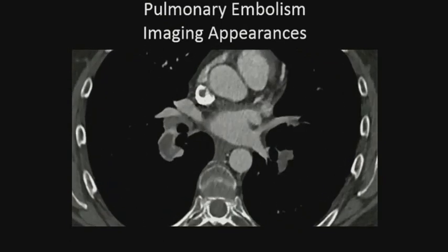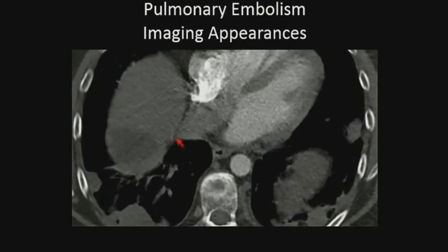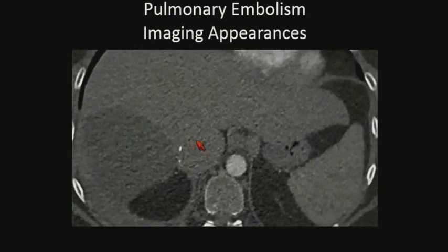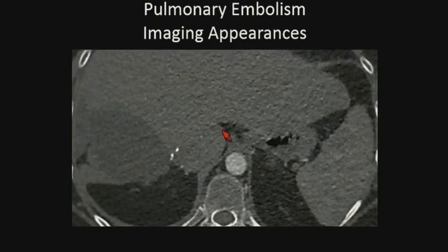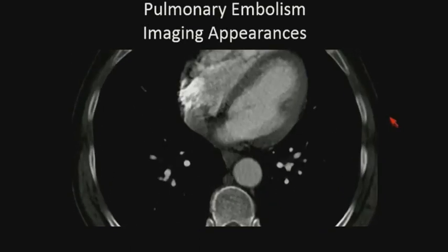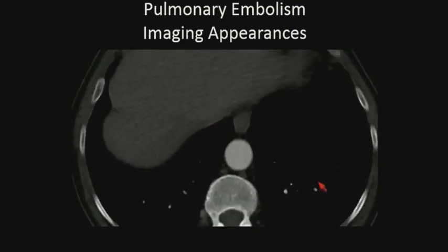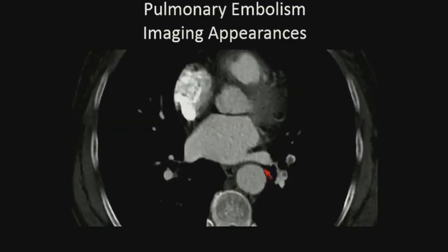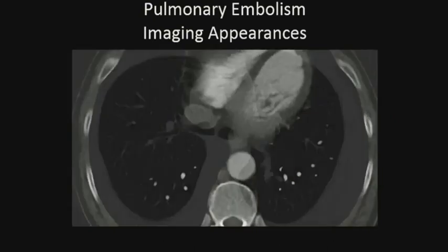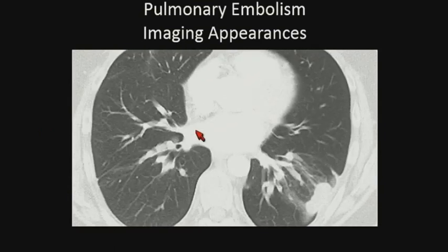The features of pulmonary embolism in the acute phase include complete arterial occlusion, as seen in this case, with failure to opacify the entire lumen of the arteries, which also may be enlarged in comparison to pulmonary arteries of the same order of branching. Acute PE can also appear as a central filling defect producing the Polo mint sign, as seen in this patient, and if seen in long axis, can give a railway track appearance.